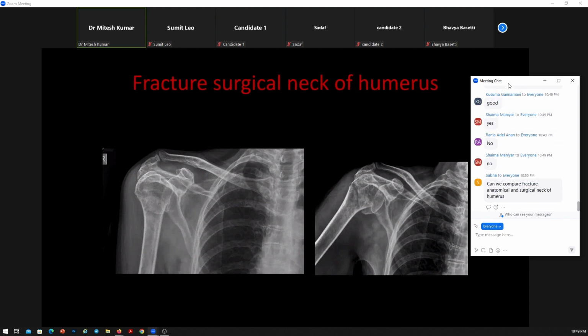But the main area of concern is the fracture, which we can see clearly here, the break in the cortex, wide zone of fracture here, and again break here in the medial cortex. Anything you want to add, Dr. Sandeep? In this I personally don't feel that there is a shoulder dislocation in this particular radiograph. I can see that the overlap of the humeral head and the glenoid looks fine to me. True. So that half moon overlap sign is there. I would not say this is a dislocation.